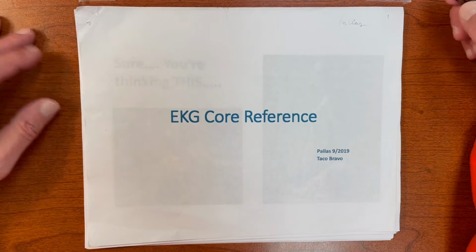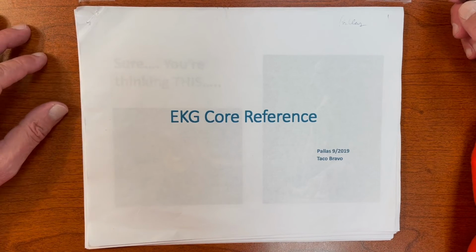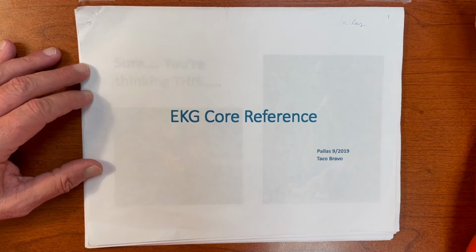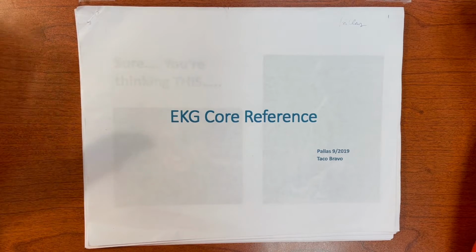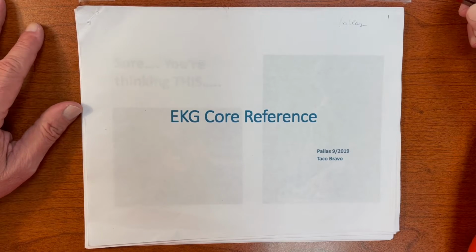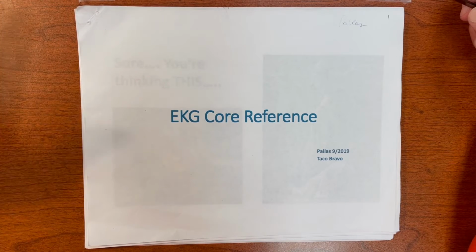This is something we go over a lot on the ward service when I'm attending. And indeed, I'm going to be showing you the packet, which you see here, is the packet that we use on the wards. Now, initially here, this is going to be an overview, okay? And it's going to introduce to you a method and a way of thinking about reading EKGs.